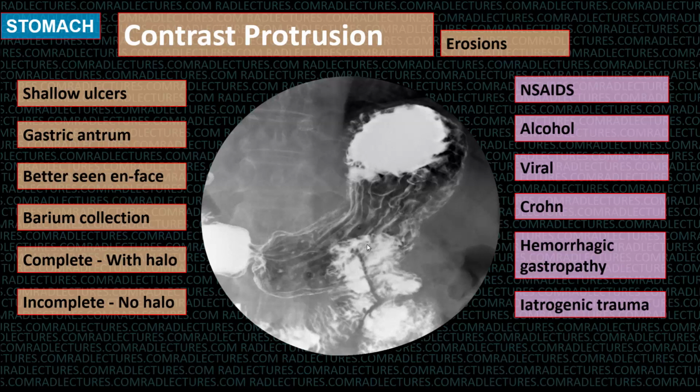The interesting thing about them is that they are not typical in H. pylori gastritis. If you see these, this is not the picture of H. pylori gastritis. What is the picture of H. pylori gastritis? Thickening of the areae gastricae and presence of nodules.